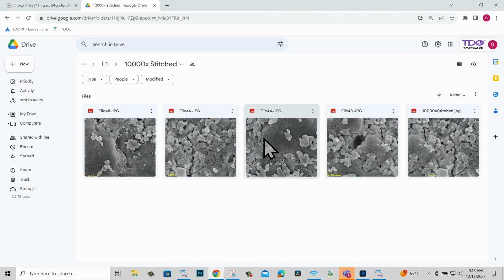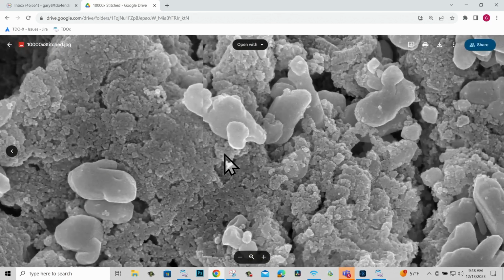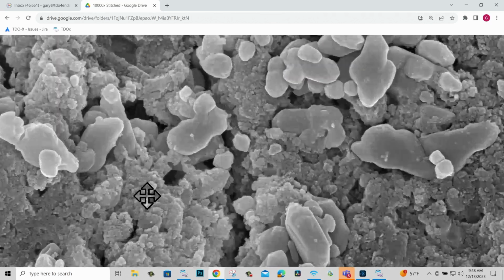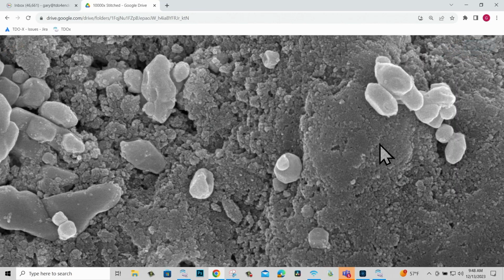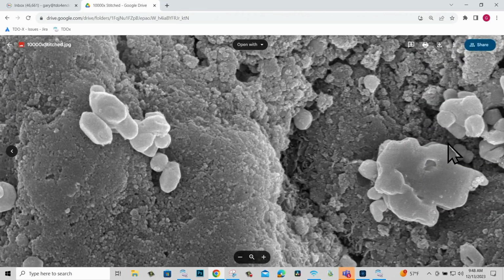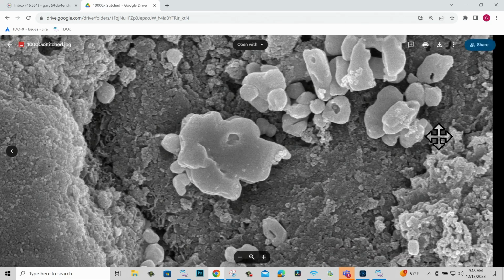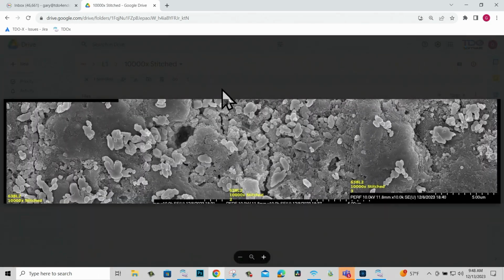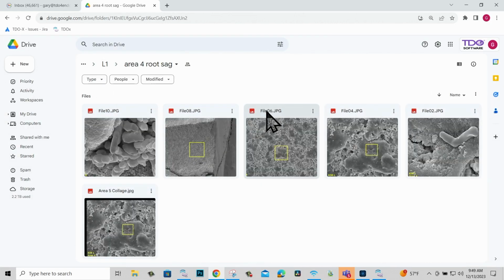When you go into the much higher magnification, you can see there's been some demineralization of the predentin, and then you see what I interpret as calcium hydroxide crystals, but there's probably also bacteria there, but it's very, very difficult to tell. So the uncertainty level here is high.